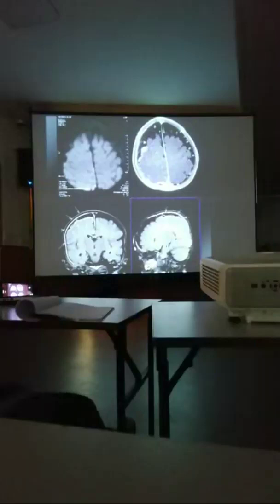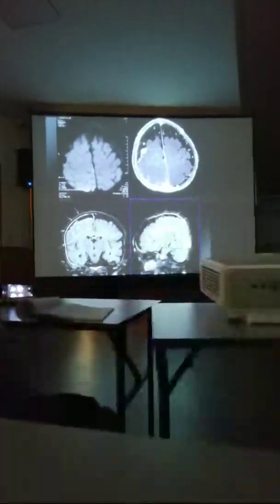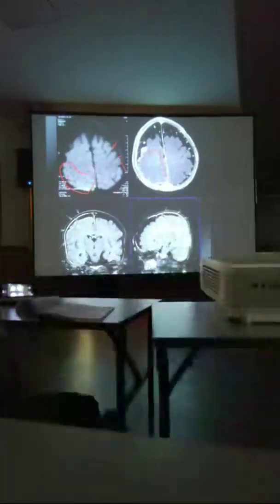This is a young child, 2 years old, presenting with fever, altered sensorium, and classical neck stiffness. The reference is to rule out meningitis. You can see the FLAIR subarachnoid spaces on the left side, which is absolutely normal. Whether you can appreciate anything over here, they are effaced, you cannot appreciate the low signal within the CSF, and they are filled with bright signals. After giving contrast, beautifully you can see the exudates. And you can see the enhancement of the meninges over here, and this is the typical appearance of subdural empyema as well as effusion.